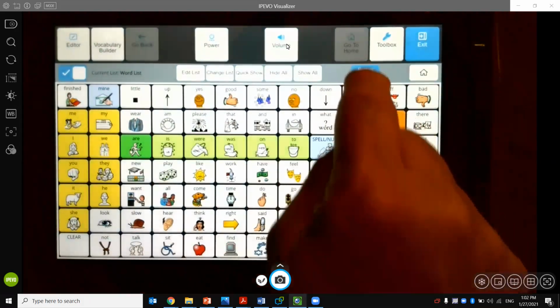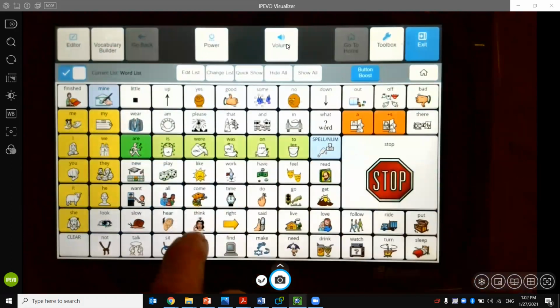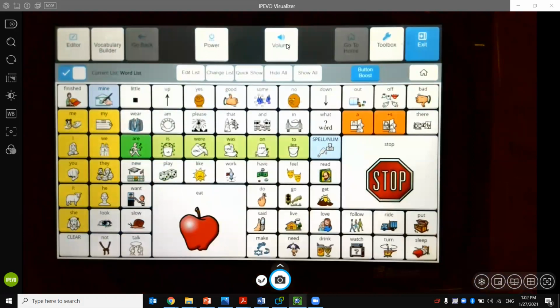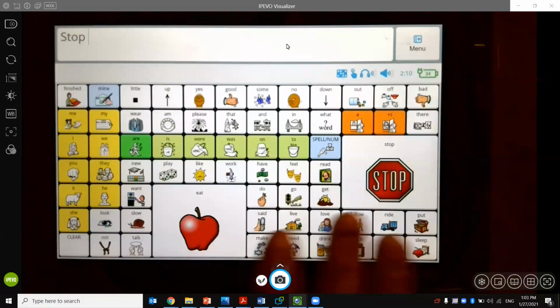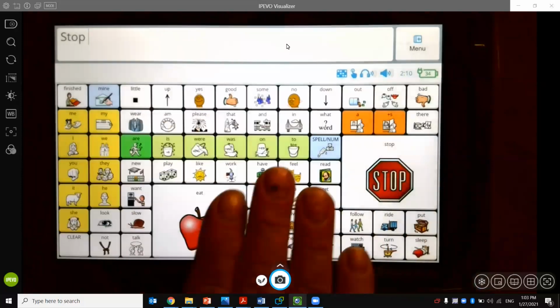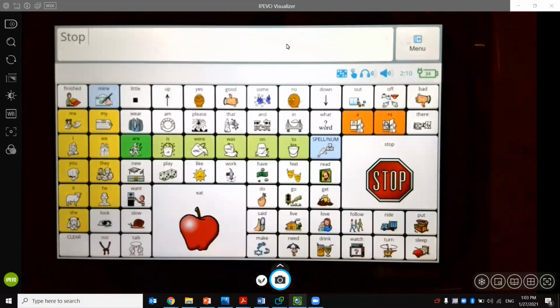So when you hit Button Boost, you touch any button, and it goes to its largest size. That'll be the largest. And then if you want to do another button, you touch that one. So really, you can go pretty quick. Now you exit. And of course, the problem now is you have this background. I personally in LAMP would never want to see something like this happening where buttons are different sizes. I love seeing the grid.